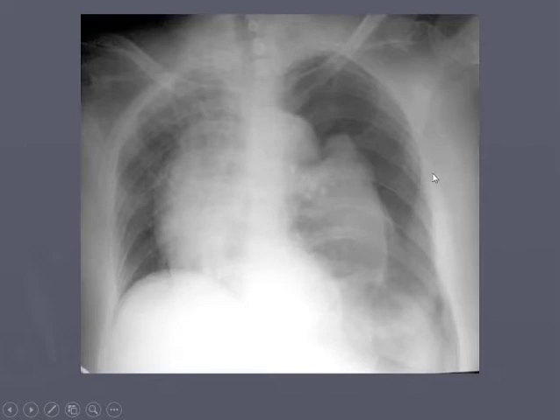Here's another example of that. I won't go through what I did on the previous one, but you can see just the lung tissue here. The diaphragm's malformed over here. We're starting to get some atelectasis over on this side. This is completely non-functional lung.